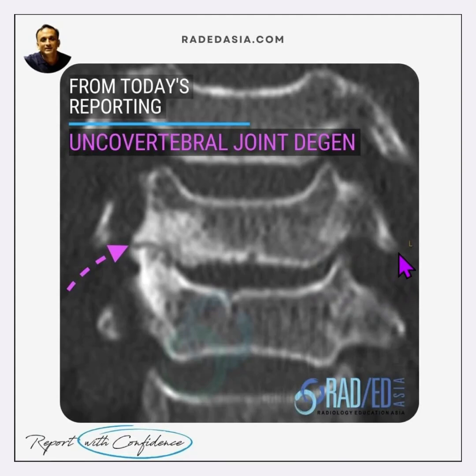CT is the best plane that I find to actually look for uncovertebral degeneration. This is the uncinate process, and that articulates with the inferolateral aspect of the vertebral body above. Now, there are a number of names for this region, but generally it's just considered the articular margin of the uncovertebral joint. So this inferior margin of the vertebral body has a beveled or angled appearance, and the uncinate process from the vertebral body below articulates with that.